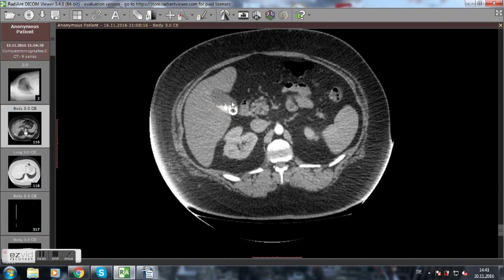And in this gallbladder, you see some round and bright structures. These are gallstones. Most people with gallstones, like 80%, never have symptoms. Also this patient doesn't have any symptoms from them. Most probably these are mixed stones.